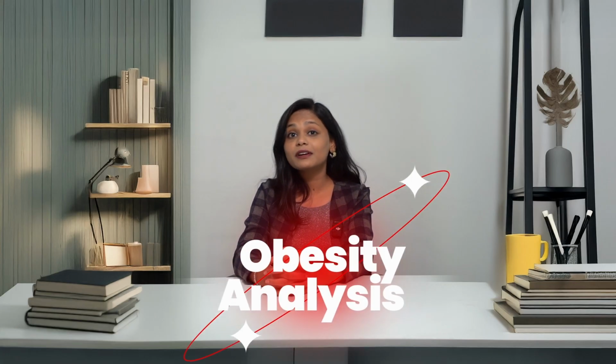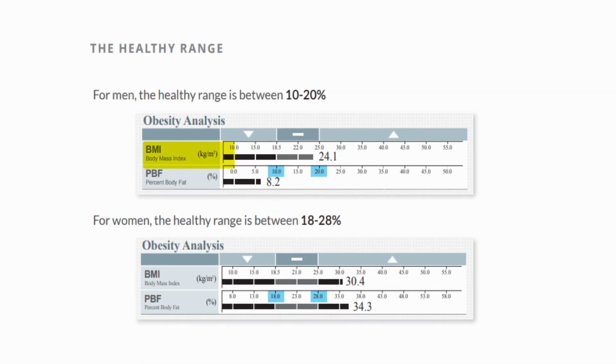Now let's talk about the third part of the result sheet, which is the obesity analysis. The obesity analysis comprises two parameters. The first one is BMI, body mass index, and PBF, which is percent body fat. So it's very important to understand that BMI is not a correct parameter to understand the health status. There are cases where the BMI is normal, but when the percent body fat is checked via the body composition devices, the percent body fat appears to be much more than what is expected. So even though a person appears normal, we cannot actually predict if the person is healthy or not.